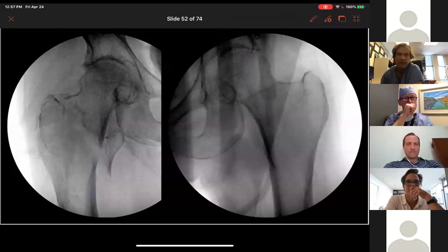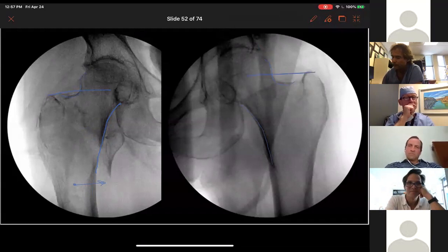So it's hard. I felt like I had lateral translation of the shaft. I felt like it needed to move that way in order to restore that medial femoral neck shaft confluence that we're seeing on the other side. I felt like the shape of the head and neck looked reasonable here compared to the contralateral side. I felt like the location of the tip of the troch was, if anything, a little bit valgus compared to the contralateral side.